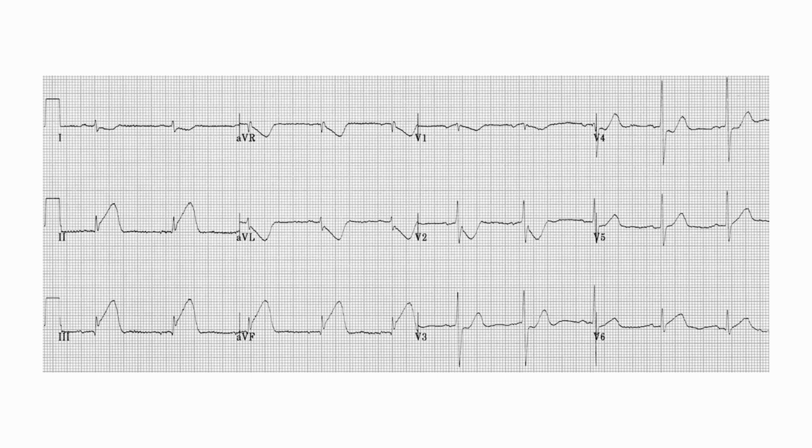The diagnosis over here is inferior wall myocardial infarction, inferior wall STEMI, and the treatment over here is same. A patient goes to cath lab. Some articles do mention that giving GTN in inferior wall myocardial infarction is contraindicated. However, recent articles have said that it is safe, but for the exam purposes, I would avoid GTN.